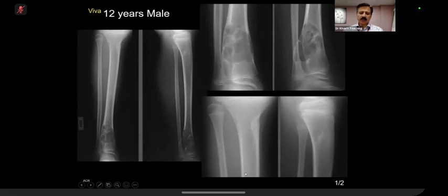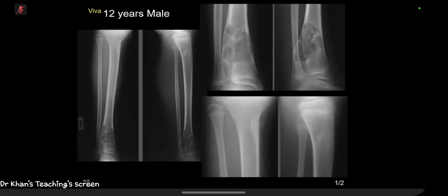Excellent. And what is happening here? So in the proximal tibia, in the proximal metaphysis, I can see another lucent lesion with a sclerotic margin, and again, no surrounding periosteal reaction, no cortical breach. So it has a narrow zone of transition, again a benign lesion, and my differential for this would include a fibrous cortical defect. It's quite eccentric.